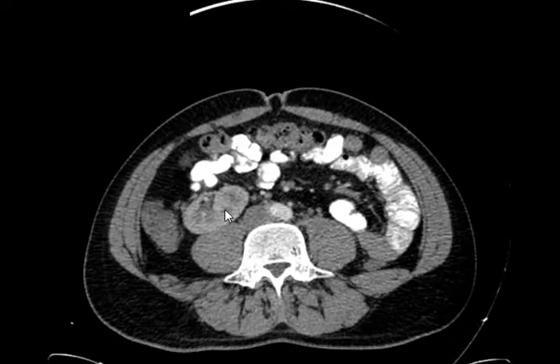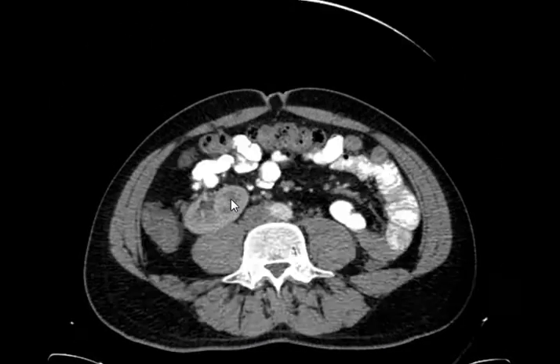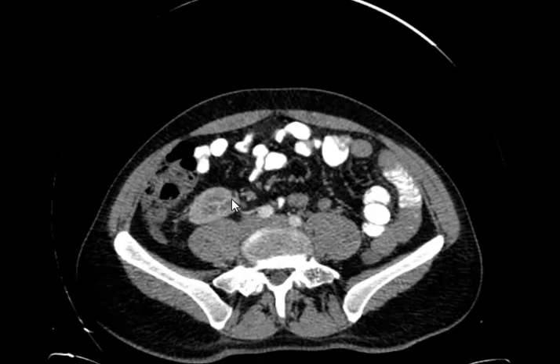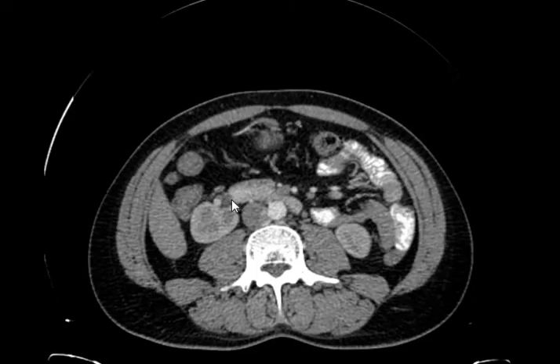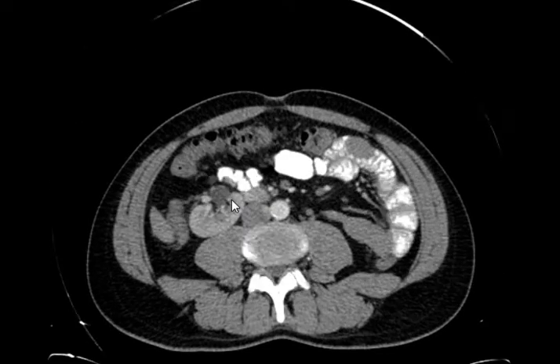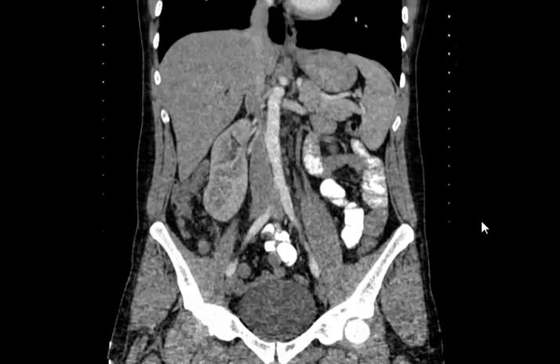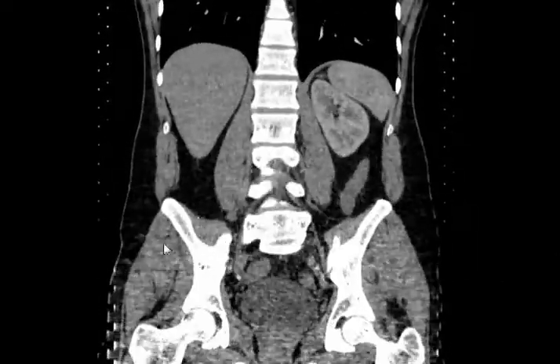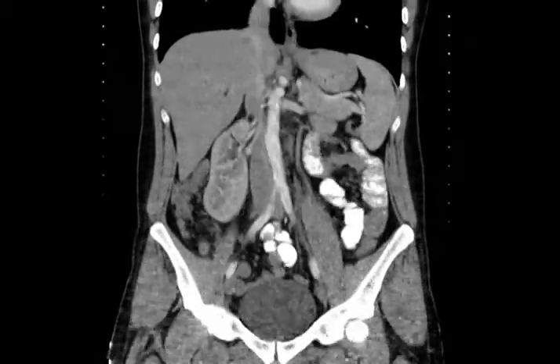No, the kidney has descended. Oh, but this is a kidney. Why has it descended like this? Why is it inferior to normal? What's wrong with this kidney? This kidney is low lying and malrotated. Okay?